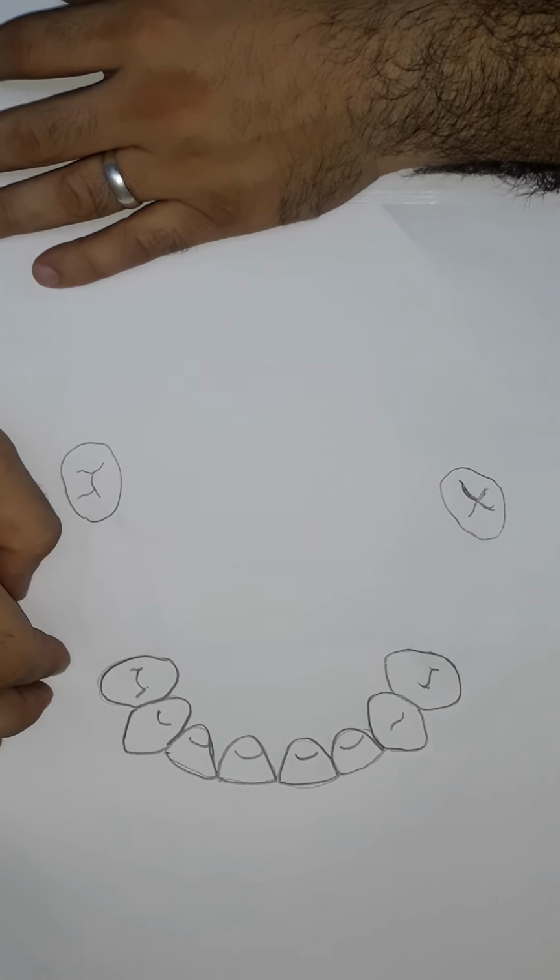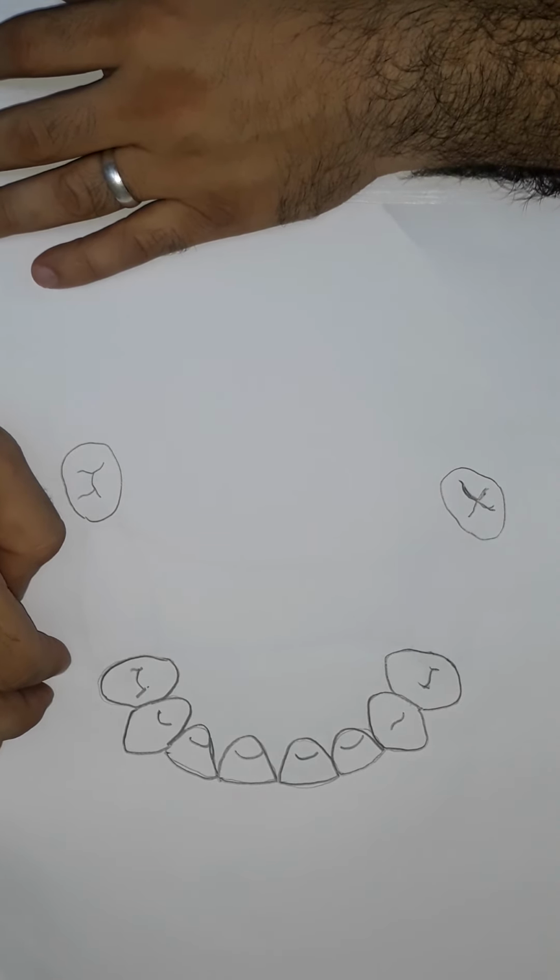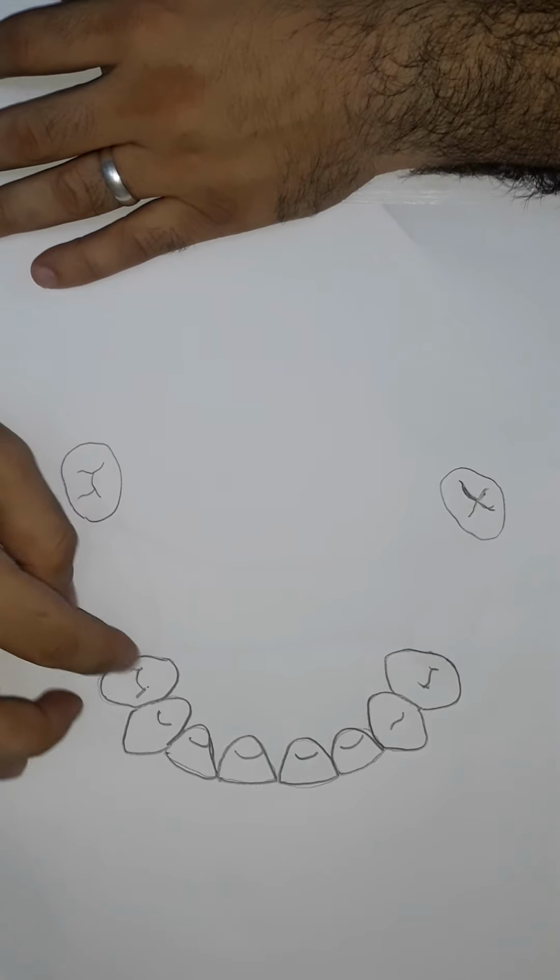I always prefer to start with determining the location of the rests. As we know, the significant feature of the cobalt chromium partial denture is the presence of supporting rests that are principally located at the neighboring abutment teeth, which are located adjacent to the edentulous span in such a Class 3 case.